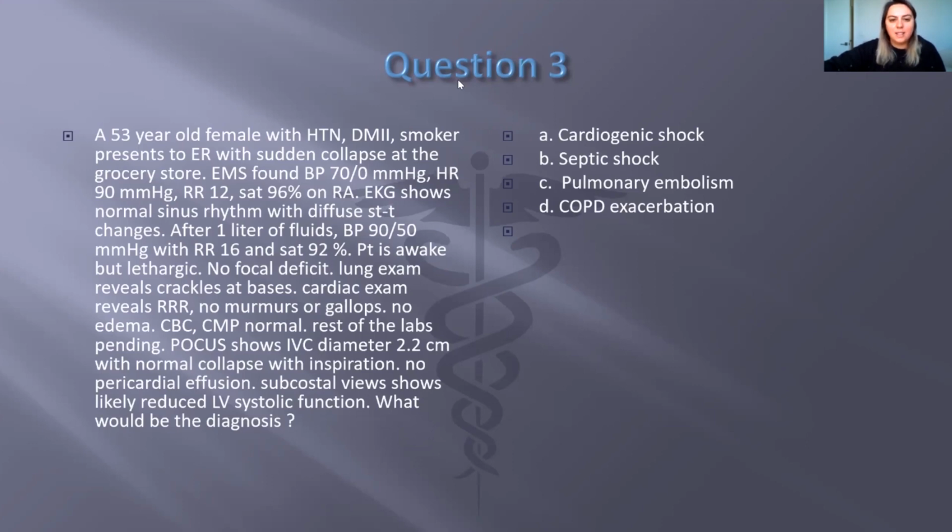Next question is, can you please explain why parasternal short is preferred over parasternal long view, and why mid-papillary view is preferred? The reason is mainly that in the parasternal long axis, you usually see the anteroseptum and the basal inferolateral wall mainly, and then up to the mid inferolateral wall. And those two are the main areas which are usually hypercontractile in septic shock, also in stress-induced cardiomyopathy, or with mid to distal LAD disease, where you don't see those regional wall motion abnormalities.